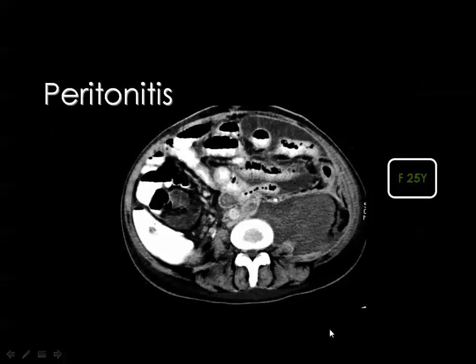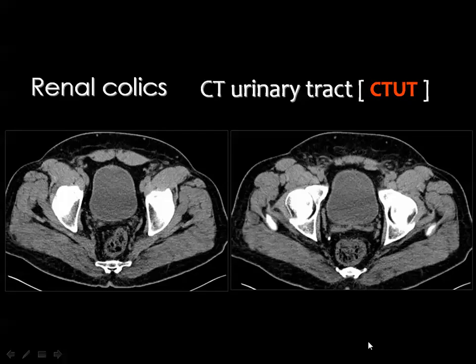And this is peritonitis with multiple free and encysted peritoneal collections, and the collections show thick enhancing margin, and they may contain air loculi representing intraperitoneal abscesses. Of course, the renal calculi or the ureteric calculi resulting in acute renal colic are considered one of the causes of acute abdominal conditions.